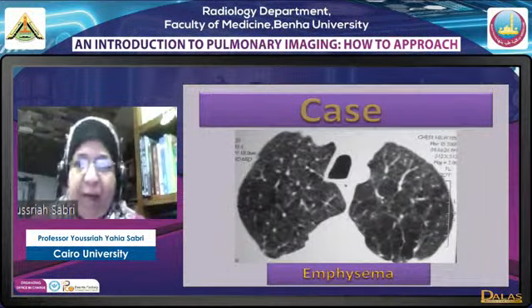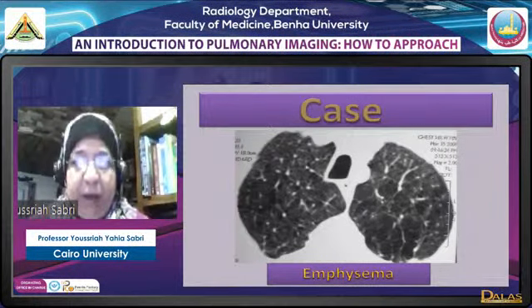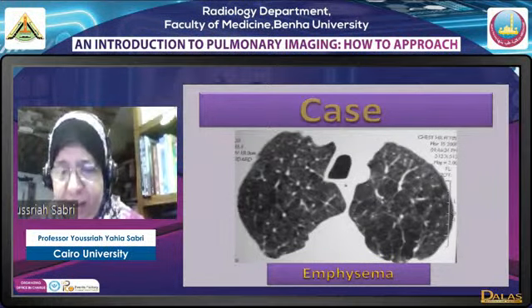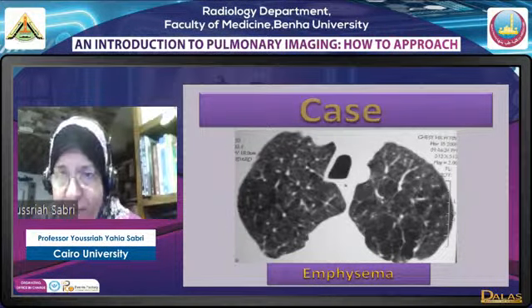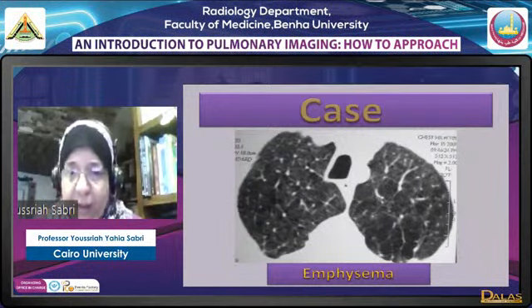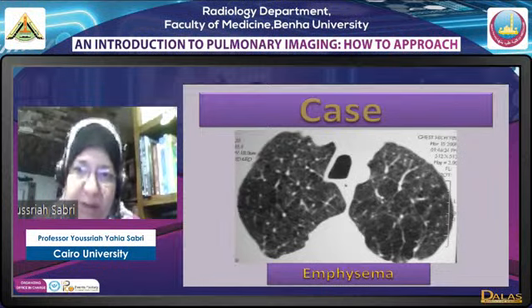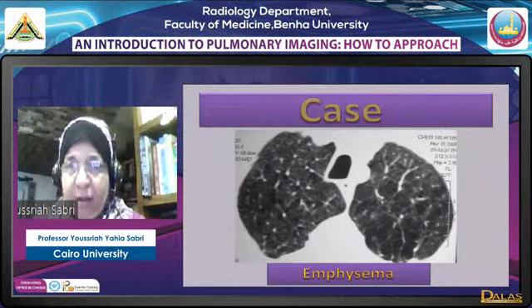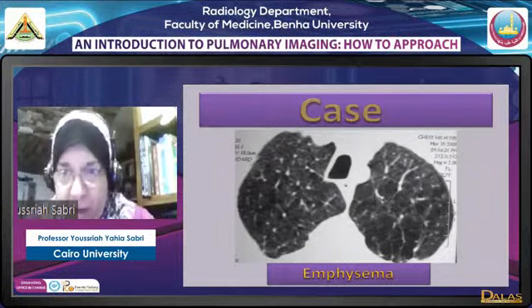Now here we have on the right lung centrilobular emphysema, and in the left lung, as you can see, there is marked hyperlucency affecting the whole of the secondary pulmonary lobule. You can see the wall of the lobule now. Now, this is severe centrilobular emphysema, and it may be considered by some as a pan-acinar emphysema. But so as not to have confusion, the real pan-acinar emphysema starts as such.